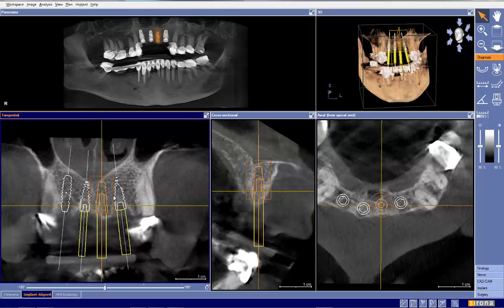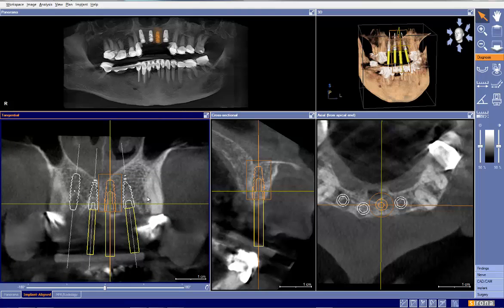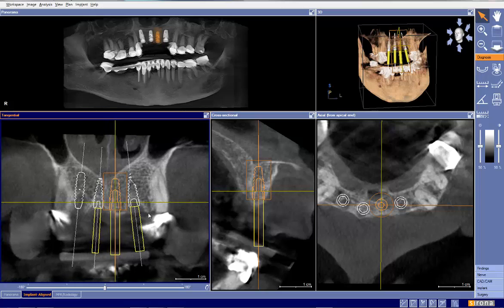In terms of the implant plan, we want to plan to replace 7, 8, 9, 10. My experience has been that we won't have enough space to be able to place 4 implants here. And the reason is between implants and teeth, we need 1.5 millimeters to 2 millimeters of space. Between implants, we need 3 millimeters of space.